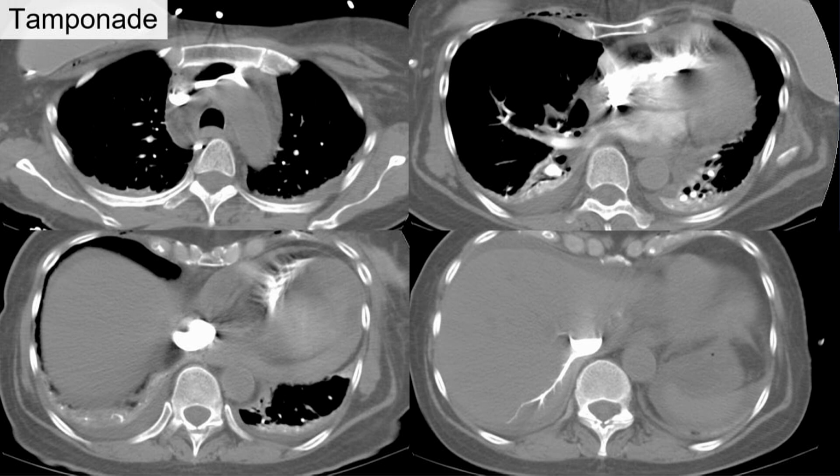You can see some contrast material here in the brachiocephalic vein, the SVC, but it's sort of stasis there. You can see that the right ventricle is compressed. There's high attenuation material within the pericardial sac here, a dilated IVC with reflux of contrast and a fluid level there, all suggesting markedly elevated right-sided pressures, and this patient was in pericardial tamponade.